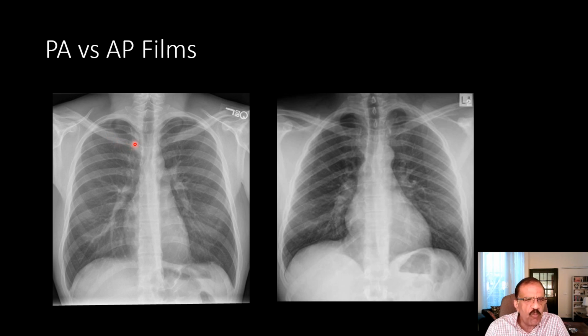Now, if you want to know which one is the second rib, then you have to come from the first, and then this is the second. This one is the second rib, and this is the anterior end. Now, there is importance of the second rib. If you draw a horizontal imaginary line which runs across the lower border of the anterior end of the second rib, this defines the lower boundary of the upper zone. So the area of the lung above this would be called the upper zone.